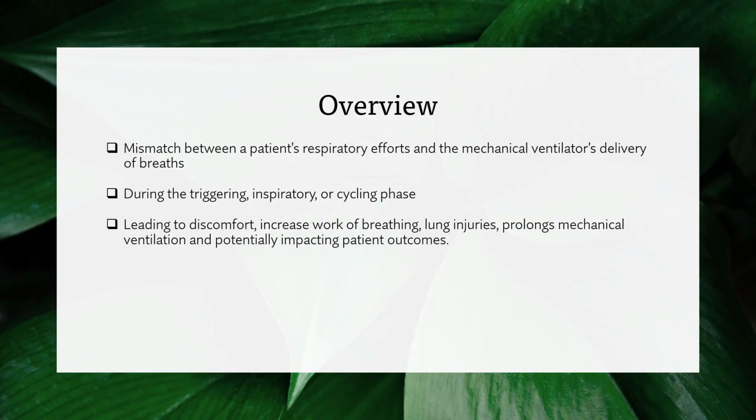Ventilator dys-synchrony occurs when there is a mismatch between a patient's respiratory efforts and the ventilator's delivery of breath. This can happen during the triggering, inspiratory, or cycling phase of the respiratory cycle, leading to discomfort, increased work of breathing, lung injuries, prolonged days on mechanical ventilation, and potentially impacting patient outcomes.